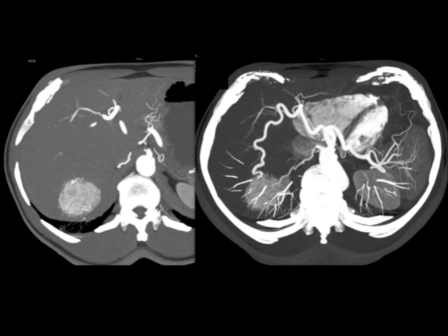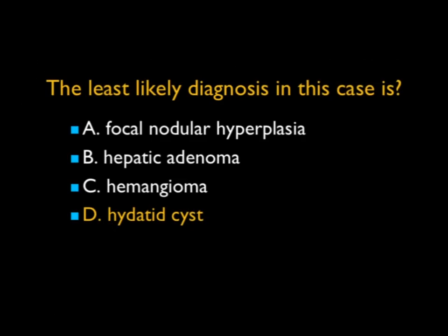Sometimes with small hemangiomas, they could be flash filling. Usually not such large lesions, but theoretically it's a possibility. The one thing this is not is hydatid cyst disease. And in hydatid cyst disease, of course, the lesions are cystic, they're not vascular, and 70% have some calcification in the wall. So just a very nice example. And in fact, in this case, this was felt to represent an atypical hemangioma.